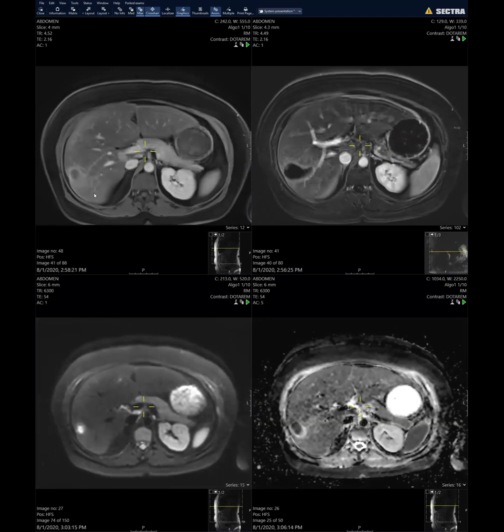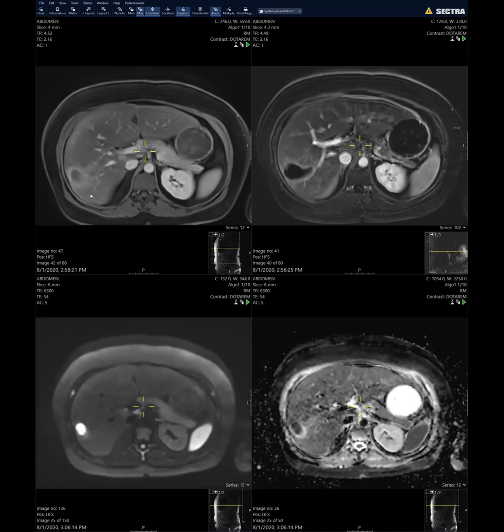So if this was just focal fat sparing, as we called on CT, then what is the, we didn't have EOVist on this one, but then the discussion is what is the explanation for an area of cystic degeneration or hemorrhage developing within the liver. So probably these are adenomas on the background of, and adenomas are known to bleed.